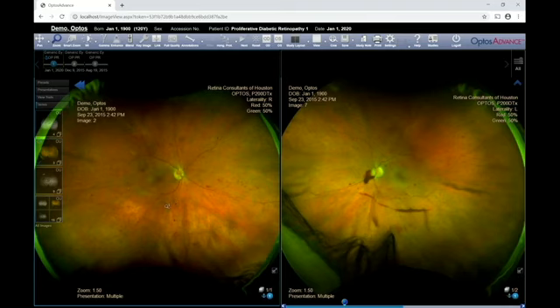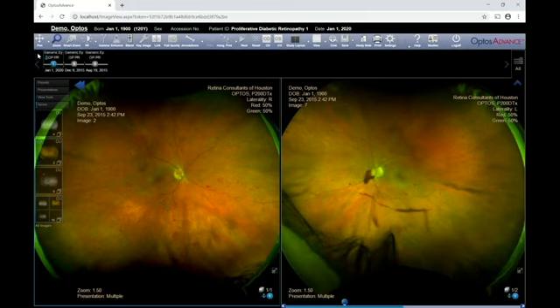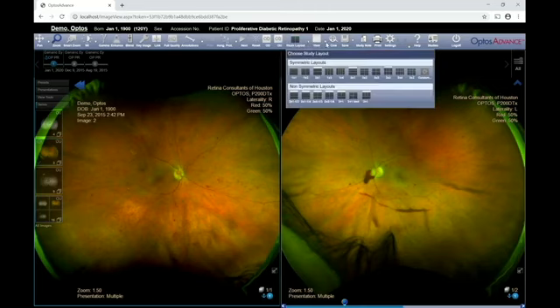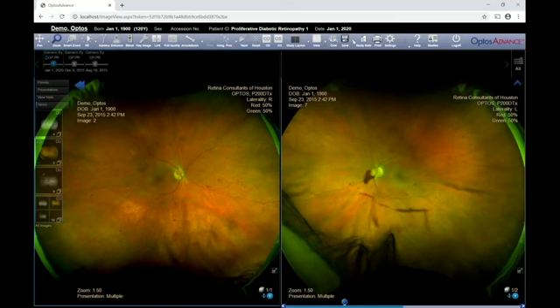Let's review the available toolbar functions. At the top: Pan, Zoom, Smart Zoom, Window Level, Gamma, Enhance, Blend, Key Image, Link, HD, Annotations, Hanging Protocols, Previous, Reset, Next, OD and OS, Study Layout, View, Cine, Save, Study Note, Print, Settings, Studies, and the Log Off.